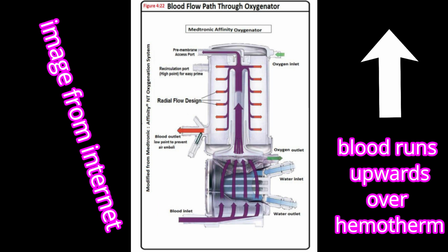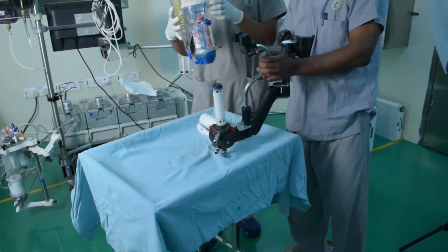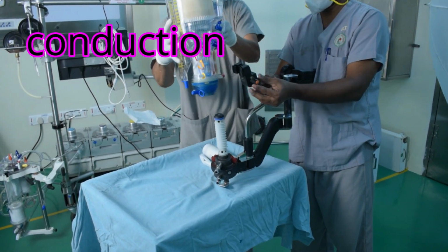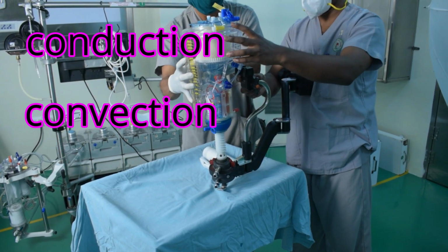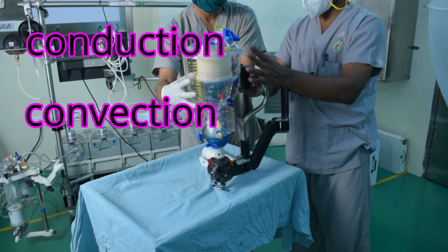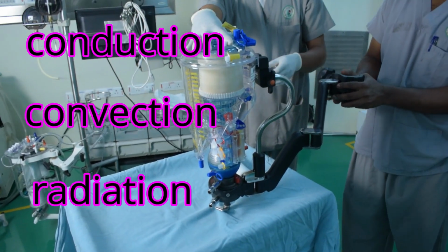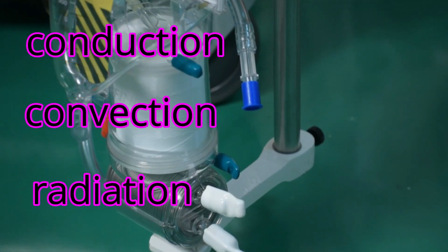Heat exchangers basically transfer heat from higher temperature to lower temperature. Heat transfer occurs in three forms. Either it is conduction that happens through solids, or convection that happens from solids to liquids, wherein the liquid is moving away from the solid-liquid interface. And the third mechanism of heat transfer is by radiation, an electromagnetic mechanism.